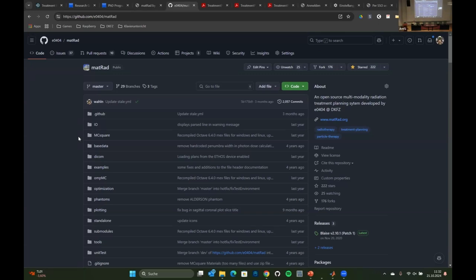Then I would rather recommend you to just follow what's happening on the screen and try to do the rest after the workshop, because you can just download the software. If we manage to fix the problem afterwards, you can just do the stuff. You don't need us, and the software will still be there for you, free to use.